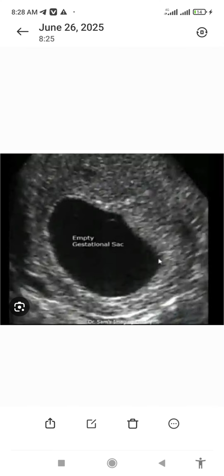And then on ultrasound scan, you will see it like this. You see a large anechoic gestational sac. It's just a sac in the endometrium with fluid content inside, but there is no yolk sac or fetal pole inside the gestational sac.